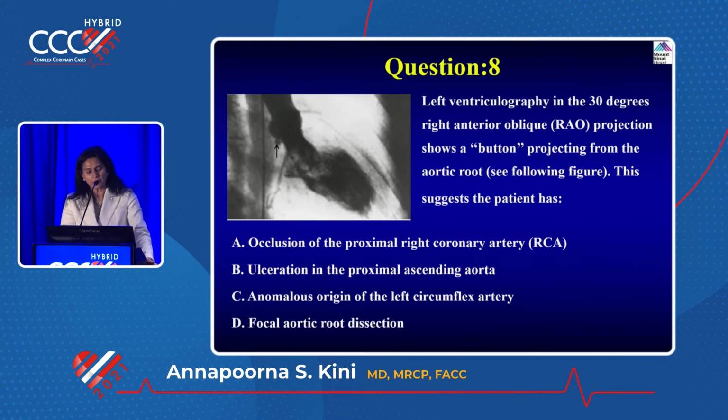They can give you any kind of questions. Somebody presenting with chest pain, MI, then they're trying to engage, they cannot find the artery, then they show this angiogram. Either what it is, what kind of catheter will you use, what would you normally see, do a different kind of EKG to understand if it's posterior MI. So the question can vary, but essentially they're trying to say if you know that the circumflex is originating and going behind. So you see that. So what is the question here? What's the answer? Origin of the left circumflex from the right.